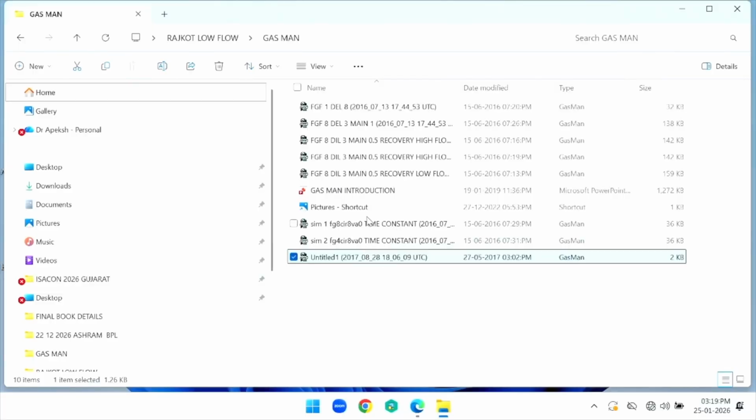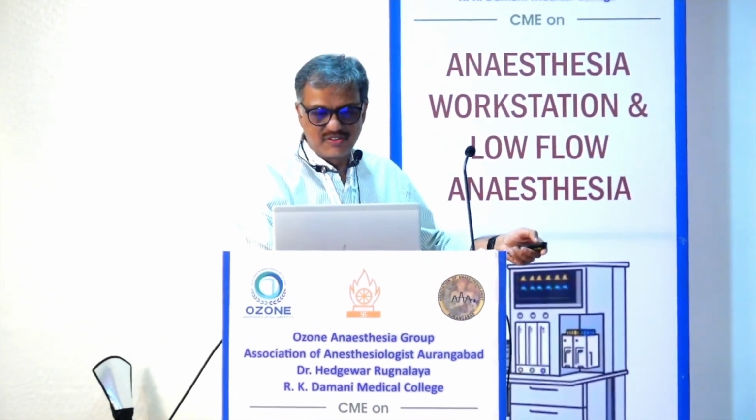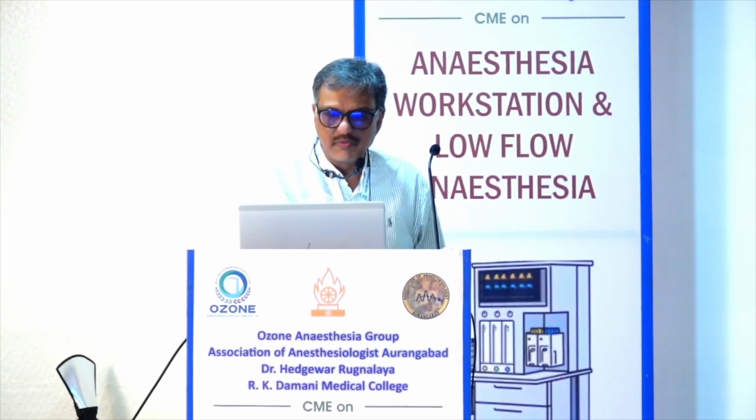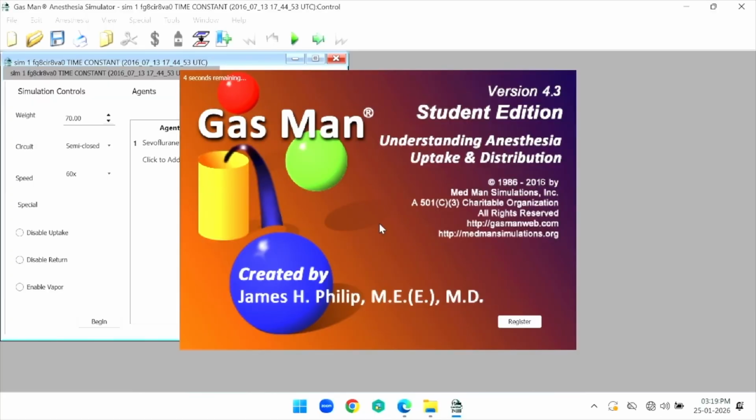Then what is your flow later on? Continue with 1.5 and the dial? Okay, change it to 2% after 10 minutes. Close it down. Okay. Should I run it again? We'll go through the detail later. Now we'll see the beauty of this software. Look, now another simulation. We'll explain the time constant with this software.